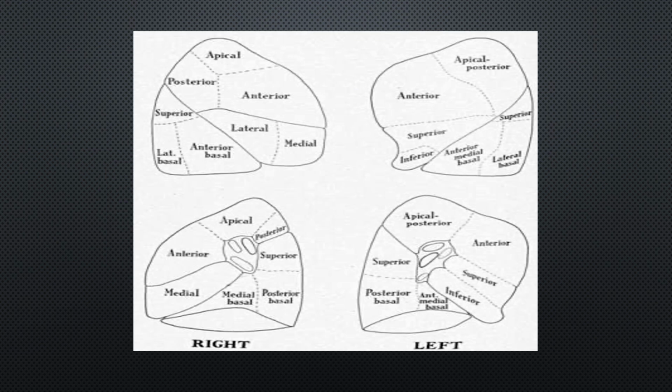To simplify it, when we see a CT scan, we are practically seeing the patient from above. So what do we expect first? We expect to see the apical segment and the apico-posterior segment at first instance when we start looking down into our patient on a CT scan cut. We go further down and we have the posterior segment and the anterior segment on the right side, and we have the entire anterior segment on the left side.